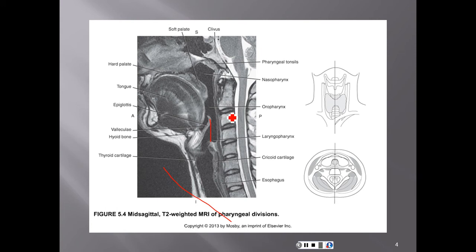And another thing I want you to pay particular attention to, and you'll see this on subsequent slides, I'm going to mark it up right now, is the anterior soft tissue. That soft tissue that lays anterior to the spine is very, very thin until we get to the point where the esophagus begins. So the prevertebral soft tissue, as it's sometimes called, can be 2 to 4 millimeters, whereas the prevertebral soft tissue at C5 should be between 5 to 10 millimeters thick.